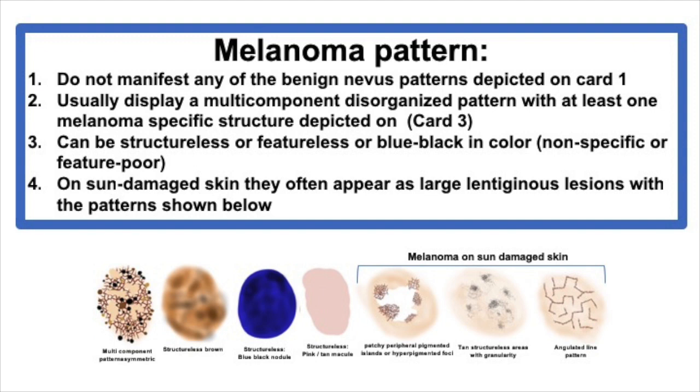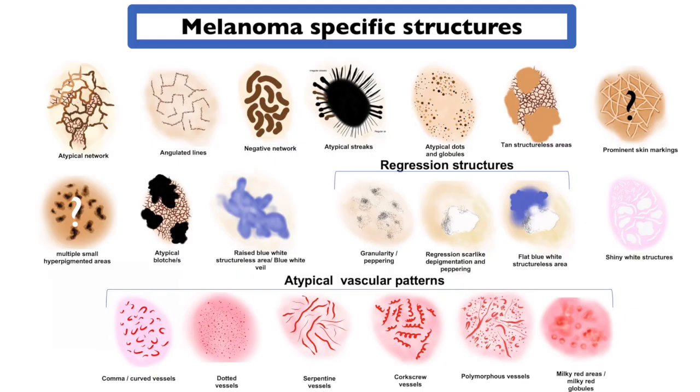That scenario. So those melanomas where we were so confident that they were benign, they actually don't occur in the hands of dermoscopists anymore, because they don't really exist. And those more symmetric appearing melanomas, such as desmoplastic, nodular, nevoid, amelanotic, right? They all have classic features on dermoscopy that will help you to know that they're melanomas, and we'll talk about those at the end. Okay, so what are the features of most melanomas?